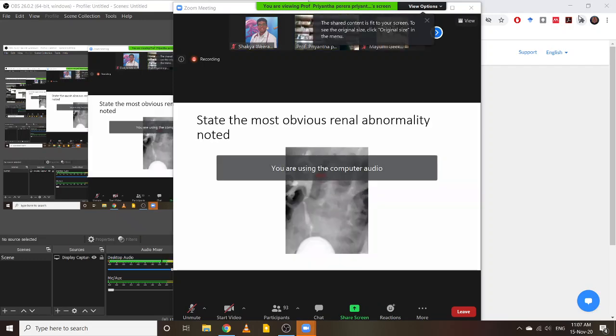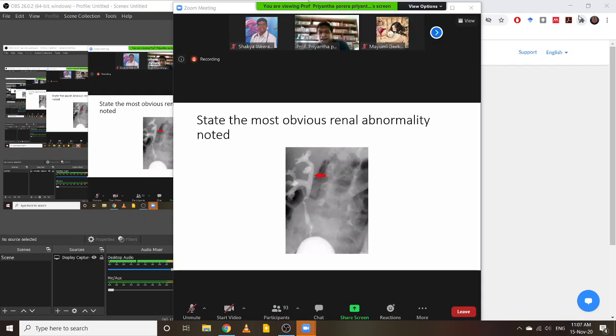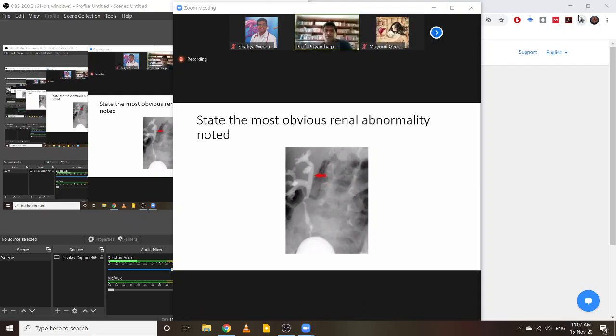Sir, unilateral double. Yes, a duplex system. Single ureter, but a duplex system here.